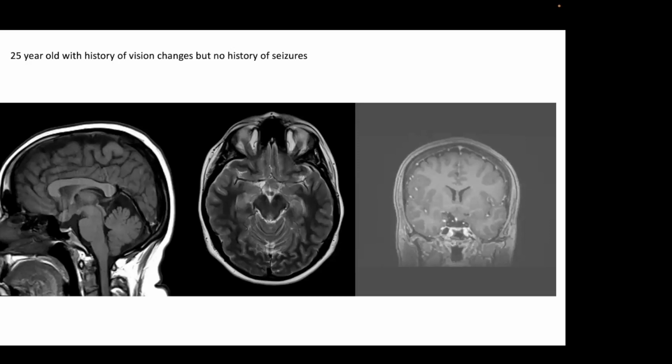Now this is an oddity. I just want to talk you through this. This one looks like a hypothalamic hamartoma. It looks like brain on the T1 weighted scan. It looks like brain on the T2 weighted scan. It doesn't enhance after administration of contrast.